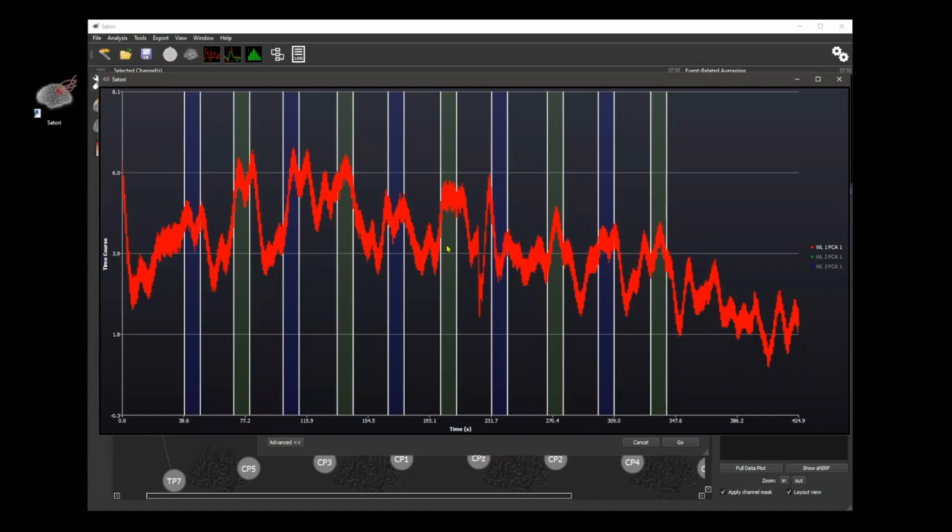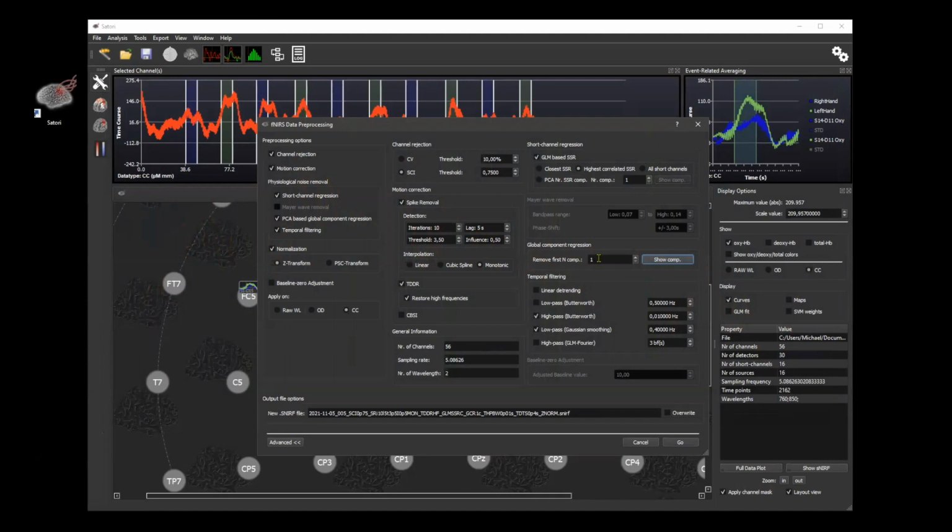As you can see, this spike that I showed you on one channel seems to be really present in a lot of channels. So if you wouldn't have short channels, it would also be an option to use this option, but with the short channel, we have much more fine-grained information, so we would prefer this one in this case.